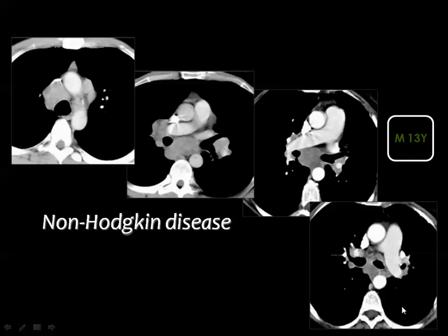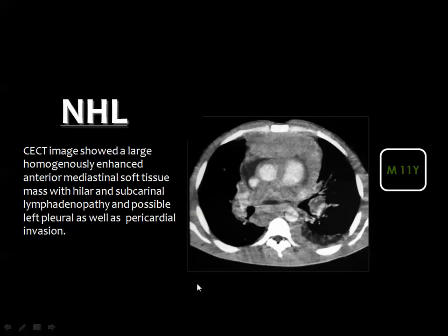And this is an example of non-Hodgkin lymphoma involving the mediastinal lymph nodes, the prevascular group, the retrocaval group, the subcarinal group, and the affected nodes are bulky, they are homogeneously enhanced, they do not contain calcium, and do not show areas of breakdown. These are the criteria of lymphoma lymph nodes.